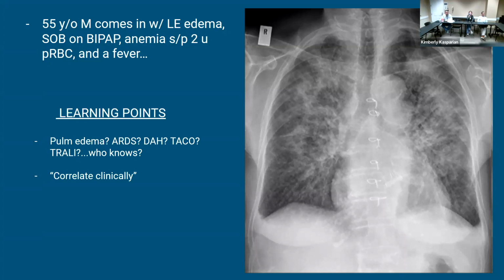But anytime you have this pattern, correlate clinically is the main key, because this chest X-ray doesn't tell me anything about what's going on other than what does the patient look like and what does their history tell me.